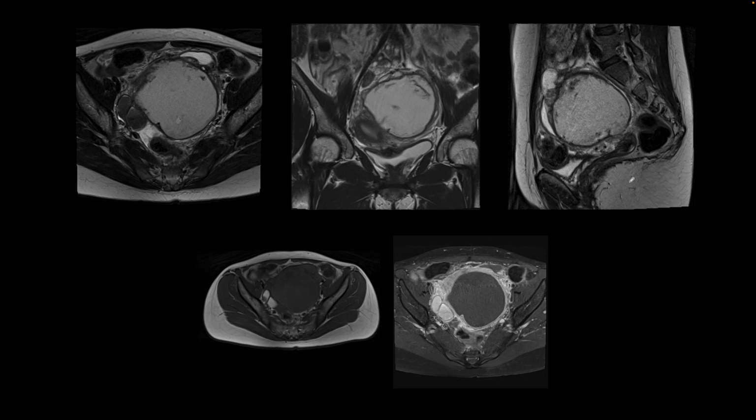This is our next patient. They presented with fever and chills, a young female of childbearing age group, and on the MRI on the top we have small field of view, T2 weighted images, axial, coronal, and sagittal, we find that there is a slightly complex T2 hyperintense cystic focus with thick walls, some internal debris, and it shows low T1 signal, and post contrast it shows a lot of enhancement. So there is capsular enhancement and there is surrounding fat stranding.